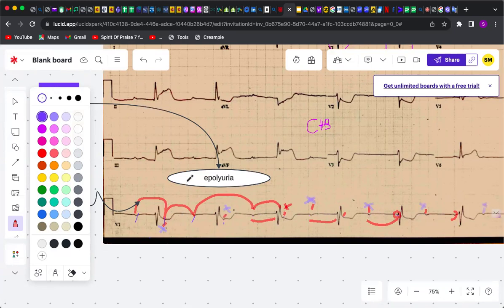And when it's in the T wave, mostly the T wave gets very pokey, or very peaked, I would say. So we have to map them. So mapping them, we could map like that as I've done here already. Okay, you map them and you map them.